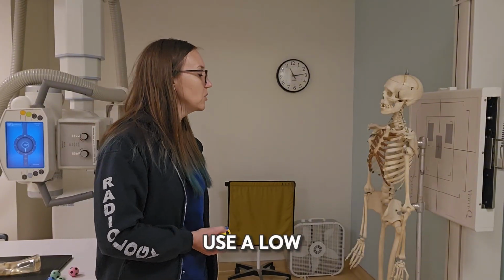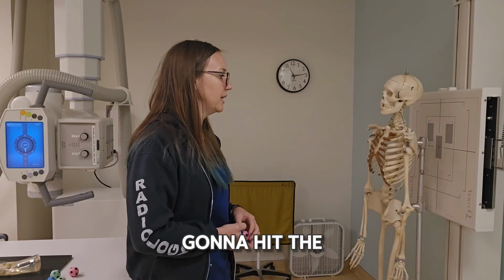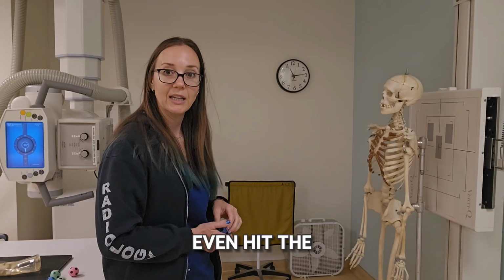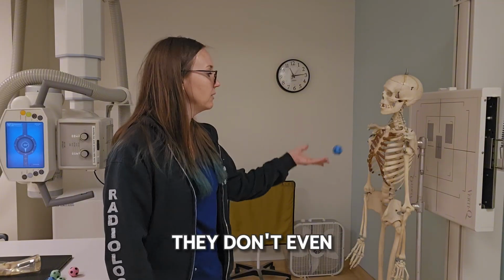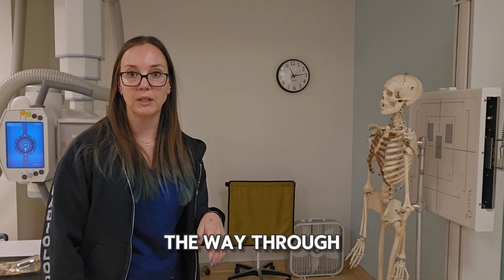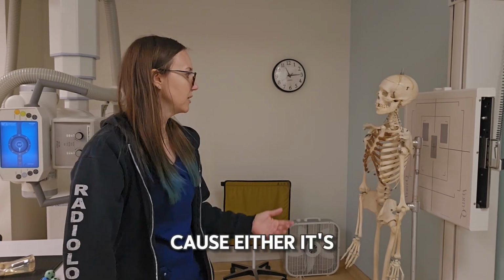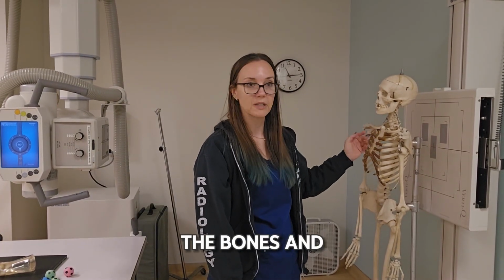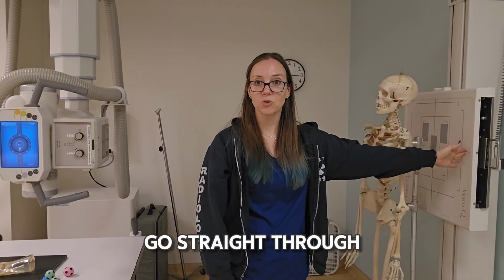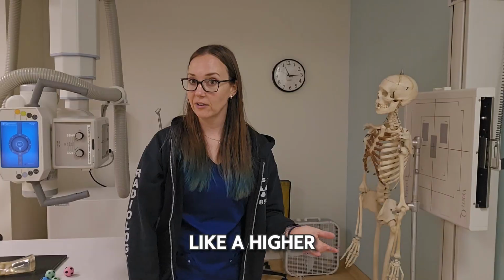So when I use a low kVp, some of it's going to hit the patient, some of it's going to hit the board, but some of it might not even hit the patient, right, the X-ray photons, because they're just so weak. They don't even have the energy to go all the way through and hit the patient. So a low kVp is going to create a very black and white image because either it's going to be attenuated and blocked by like the muscle or the bones and stuff like that, or it's going to be transmitted and go straight through and create the black. It doesn't really allow for a lot of grays like a higher kVp.